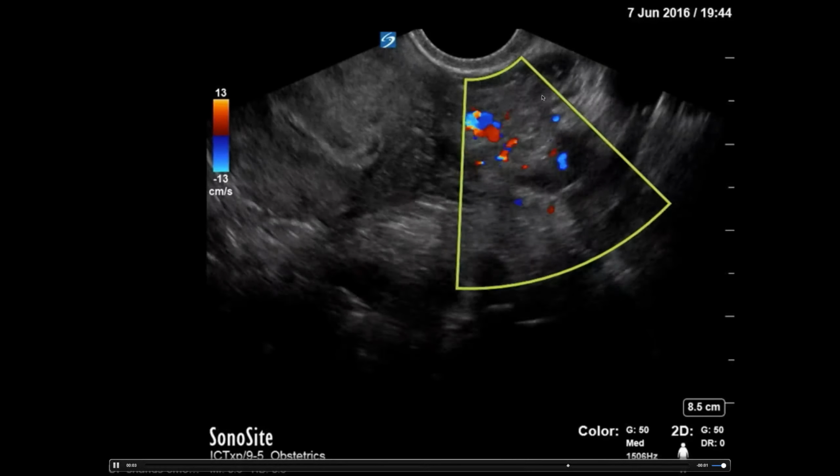So again, our diagnosis is NDIUP with extremely high risk for ectopic pregnancy based on a 97% probability of ectopic with the visualized complex adnexal mass and free fluid. Case 16. Is this ever going to end? Well, nothing teaches like repetition, guys, so we'll just keep on rolling.